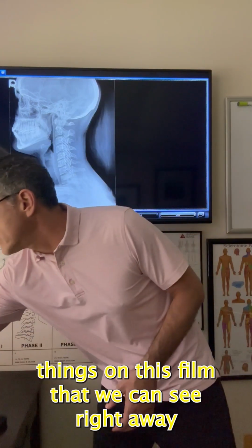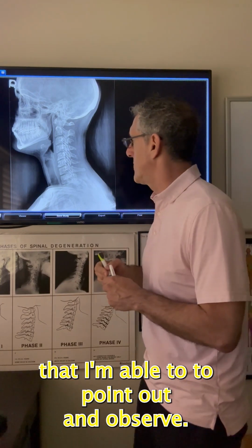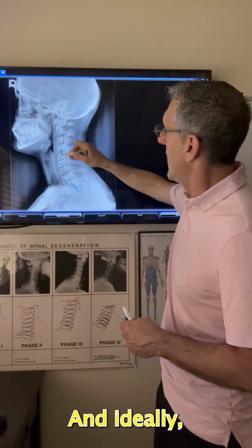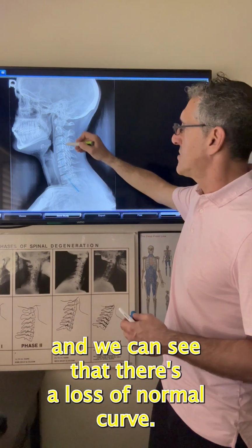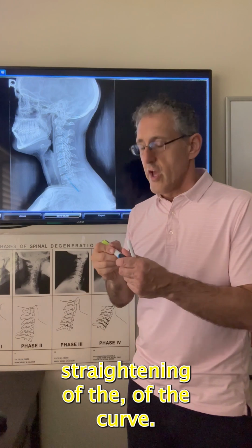And there are a couple of things on this film that we can see right away that I'm able to point out and observe. The first is there's a loss of normal curve, or what we would call a typical cervical curve. And ideally, we would like to see a curve that arches toward the front. We can see that there's a loss of normal curve. There's a near straightening or a complete straightening of the curve.